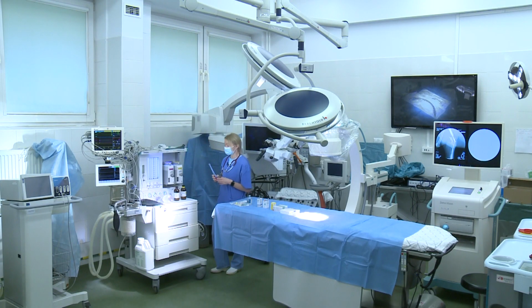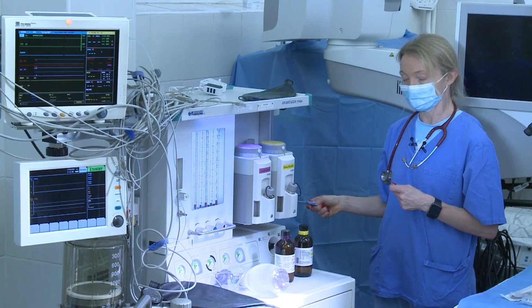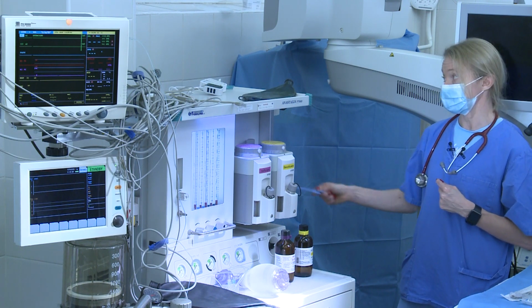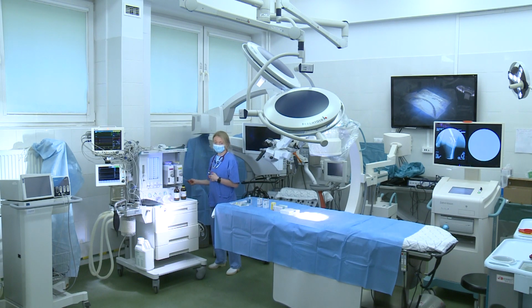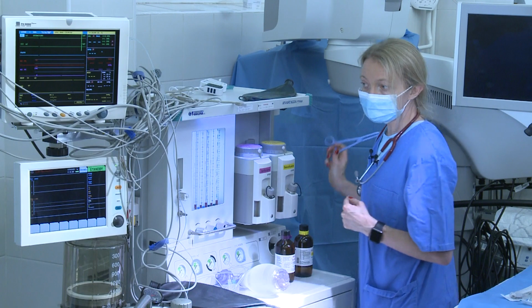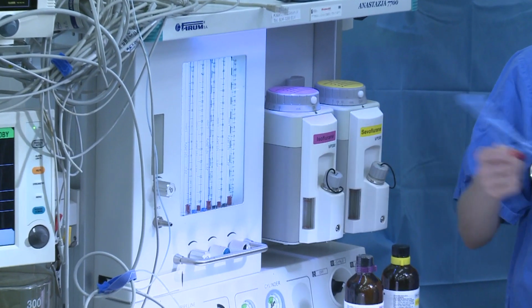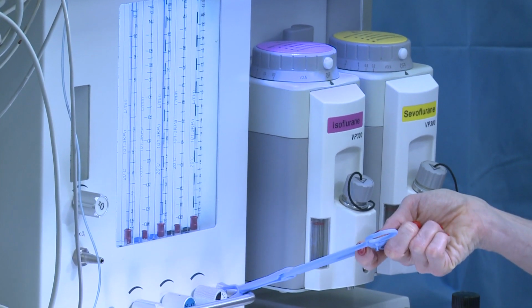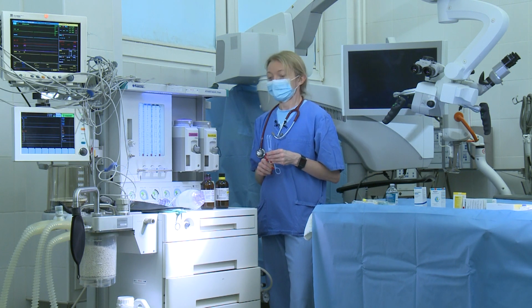pipeline system. That is why, when you heard lately in the media that each country and each government tried to organize temporary hospitals, believe me, the biggest problem inside is this type of pipeline used for oxygen and medical air. So we have oxygen and medical air from the pipeline system or from the bottle cans. All this fresh gas goes to the flow meters, which allow us to adjust the flow of oxygen or medical air for our patients, which are very different.